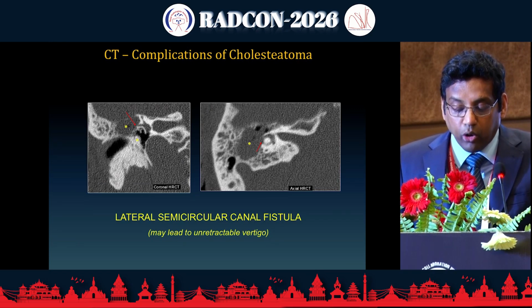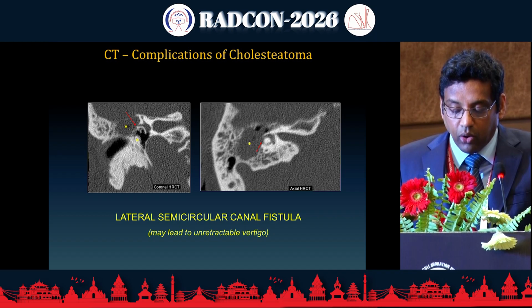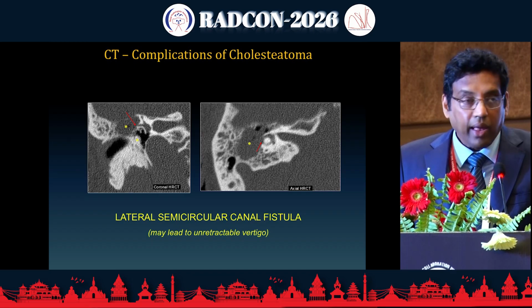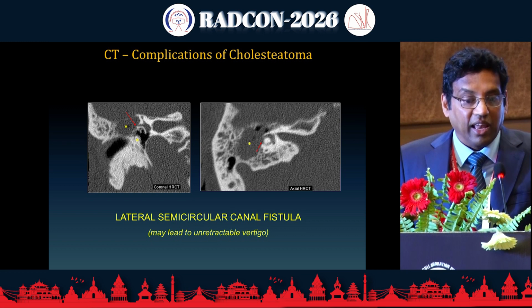And then it makes its way towards the mastoid, and you can see that widening of the aditus. Normally the aditus is quite narrow, like an hourglass shape, so all that, and then it goes into the mastoid. If you leave it longer, it starts eroding the bones of the mastoid, like the sigmoid plate, the lateral cortical bone, and also the medial cortical bone, where it comes into contact with the bony labyrinth and the facial nerve canal. So you need to operate as soon as possible before it comes to this stage.